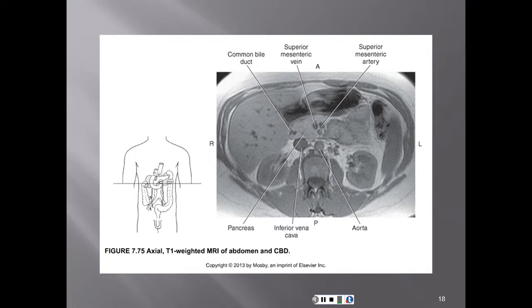Axial T1 weighted MRI of the abdomen and CBD. CBD stands for common bile duct.